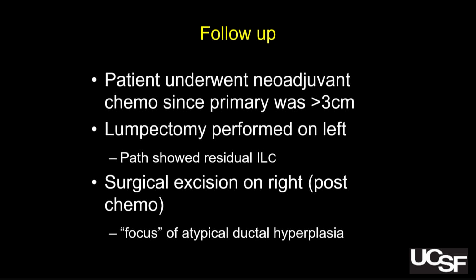So this patient is one of those that's going to be recommended for annual MRI surveillance because of the high risk and personal history and also the ADH. So sometimes it's not a perfect resolution to your biopsies, but just showing the challenges that we face. And again, working with the team to manage the patient safely.